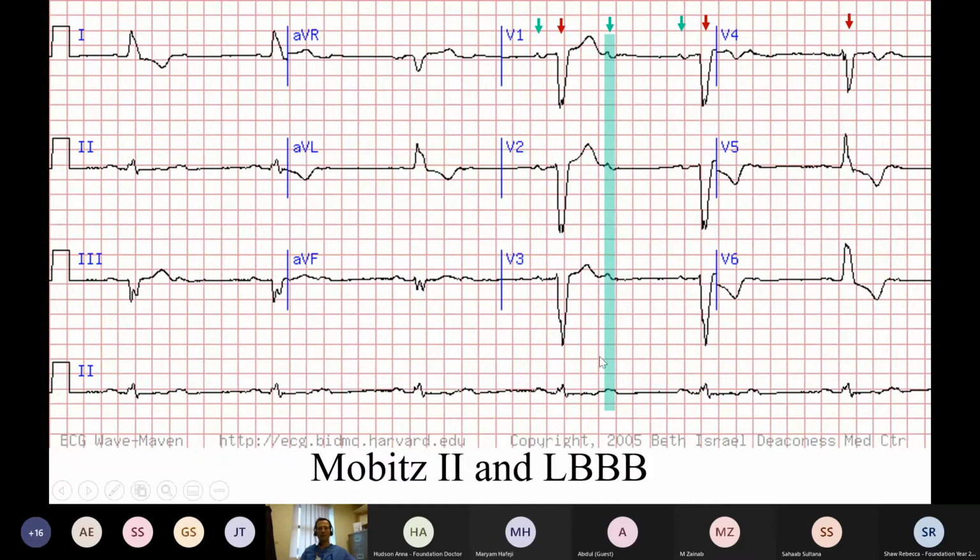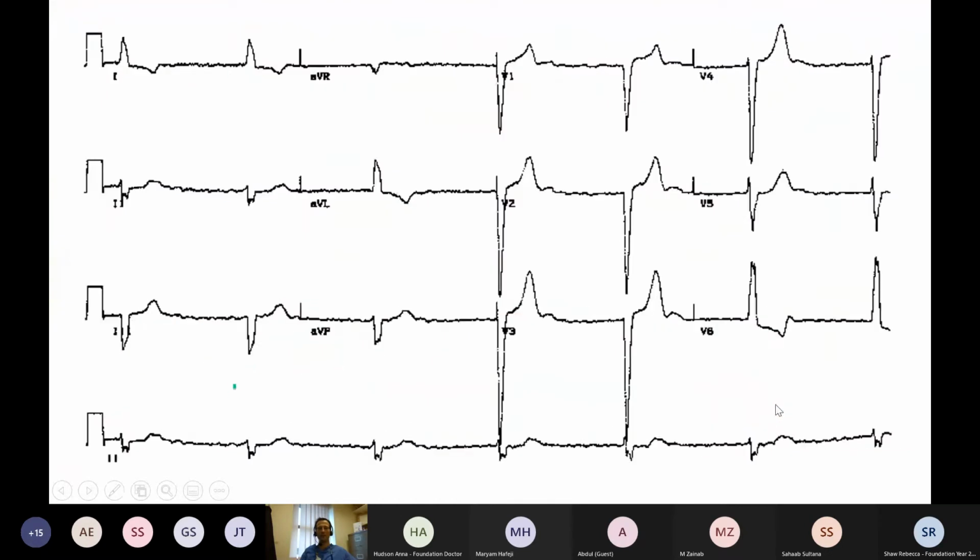So a little bit on a 24-hour ECG, by which I mean a couple of beats. You really need to have at least two examples of the 2-to-1 heart block to call it 2-to-1 heart block. Otherwise, you might just call it a dropped P wave. But if you see that on a 24-hour ECG, that would need a pacemaker, but it wouldn't need an admission. If they're in it all the time, it does.